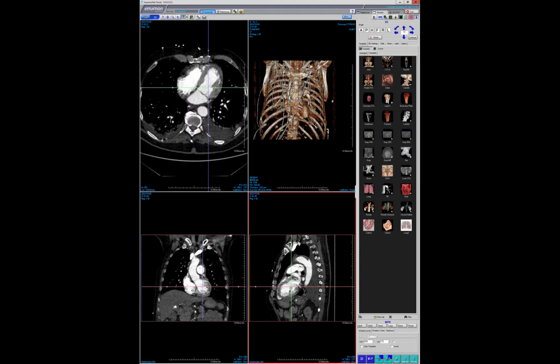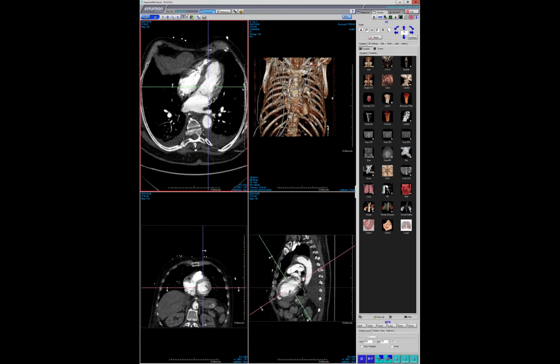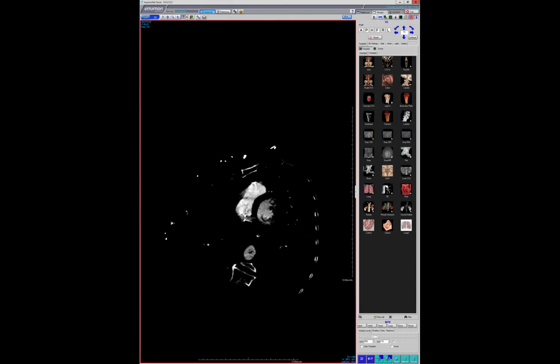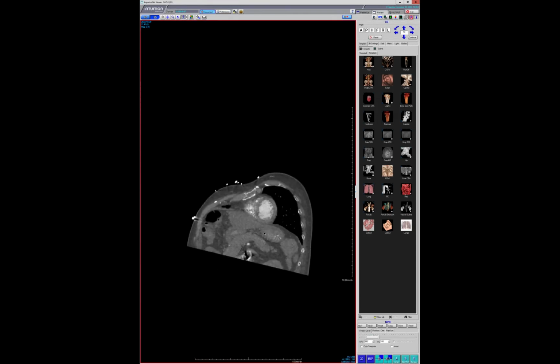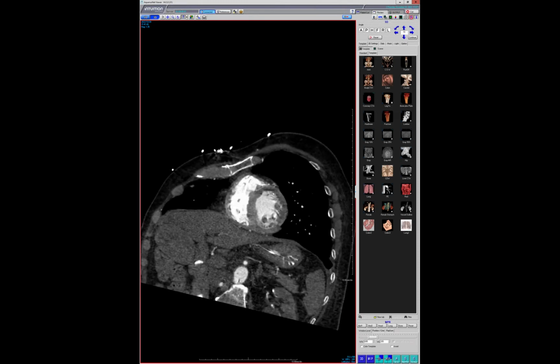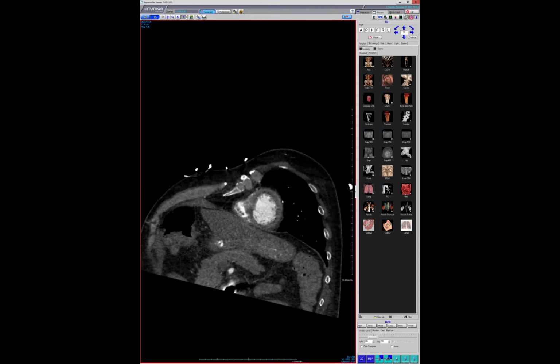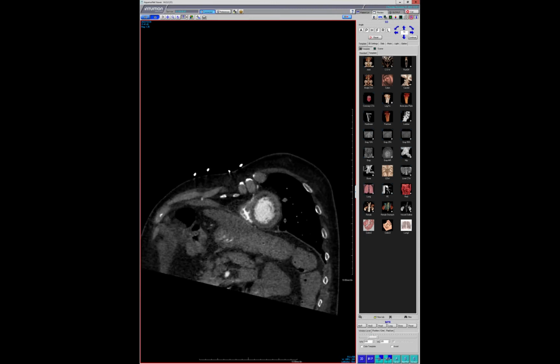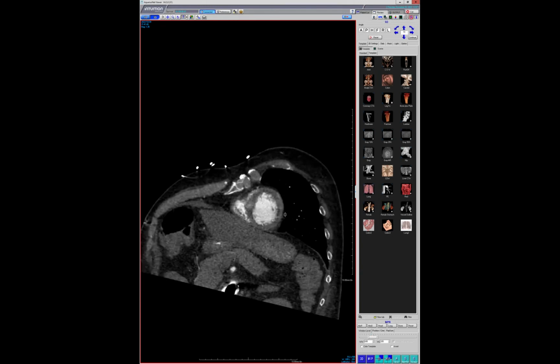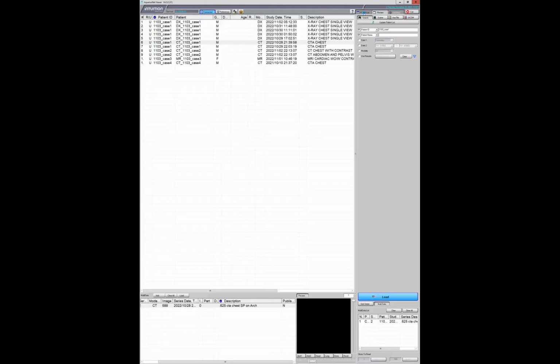And this is only the start of the story, so it gets kind of interesting, but I'll just quickly show that. You can see all this subendocardial hypoperfusion here in the LAD territory. So really anterior wall, anterior septal, even going to anterior lateral, he must have a big LAD with a lot of diagonals. And as we get towards the apex, circumferential, because in most people the LAD supplies the whole apical segment. Well, it depends on the patient's anatomy.